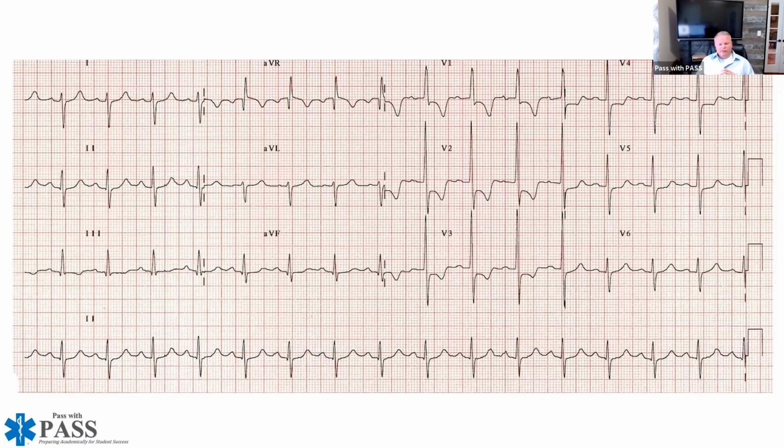I'm going to give time for everybody individually in your firehouses to look and tell me what you think about this EKG. And actually, if somebody will unmute or put something in the chat, I would appreciate that. So just as a group, you guys look at it and tell me what you think, or what do you see on this?